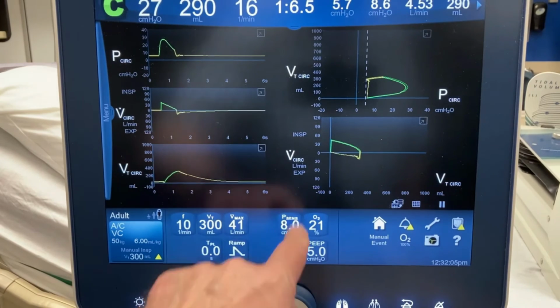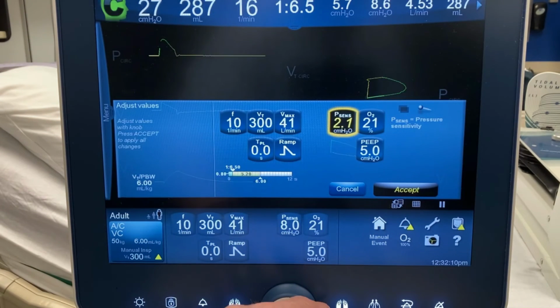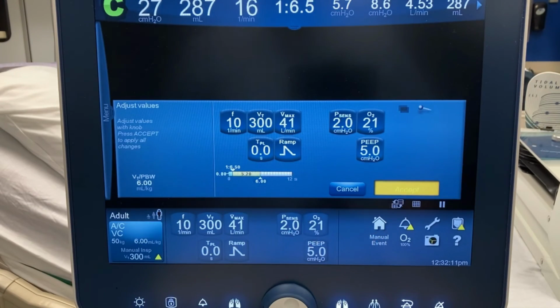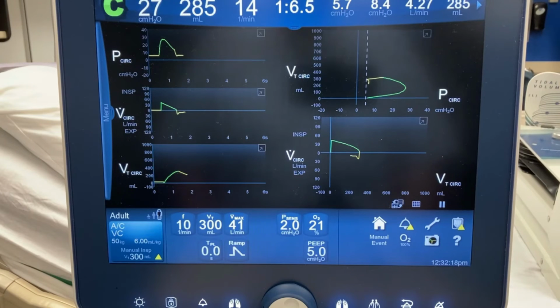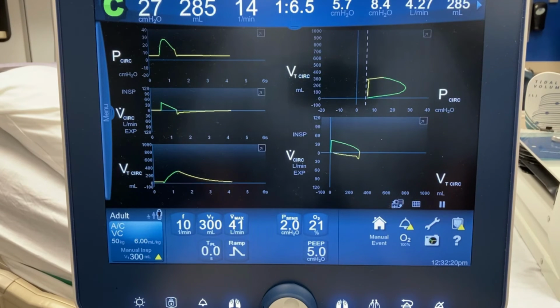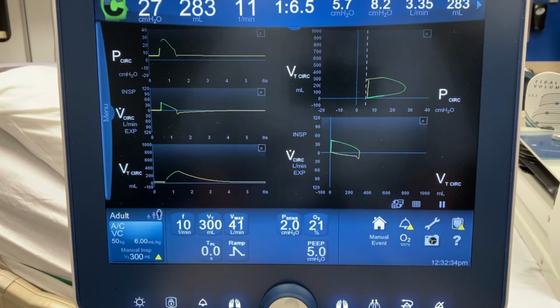All right, so we want to definitely fix that. I know people probably use flow sensitivity. The problem with flow sensitivity, if you're giving an inhaler, is that a lot of that medication just gets whipped right around to the exhalation side because there's that constant base flow going through there. So when we give inhalers, we really should switch to pressure sensitivity so that you don't have that flow kind of blowing that medication into the expiratory side, because then it's certainly not going to the patient.